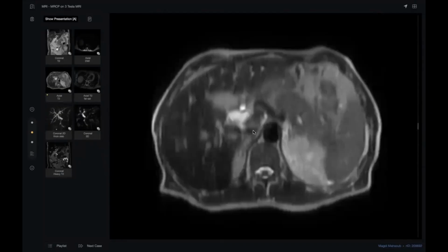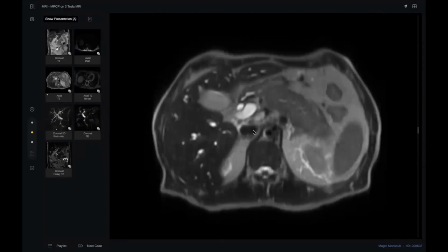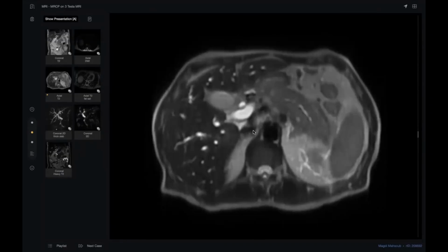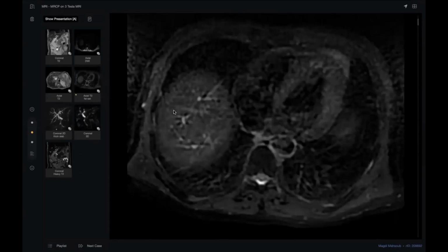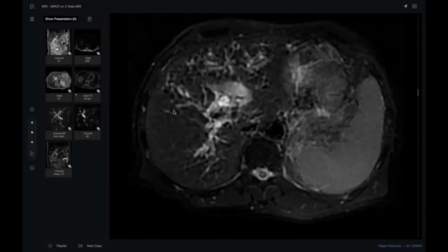Okay, look here again, please. Look. What happened? The dilatation. Yes. In sclerosing cholangitis, we are worried about something. Sir, there can be small biliary collections or abscesses. Also, the small collections are noted. Okay.